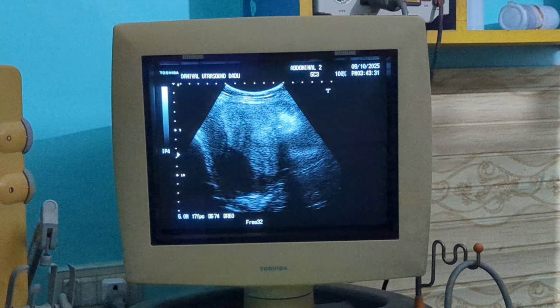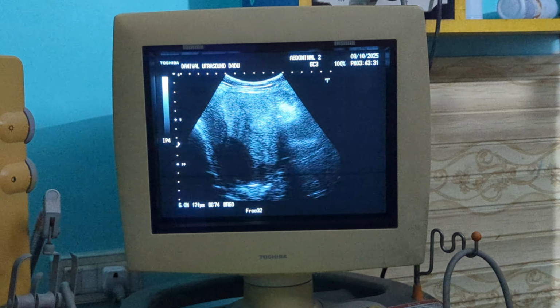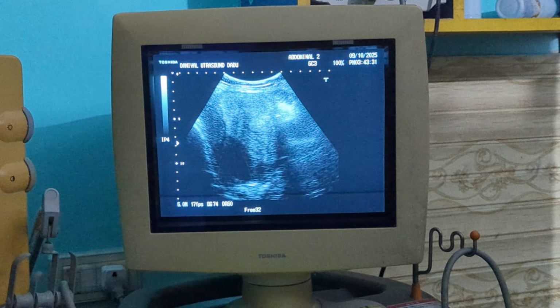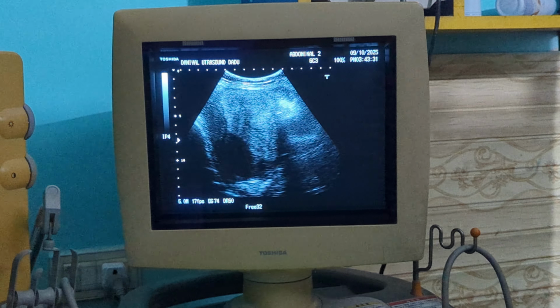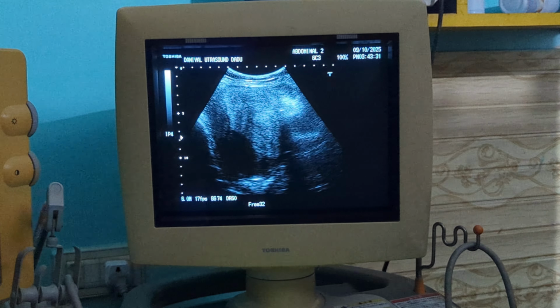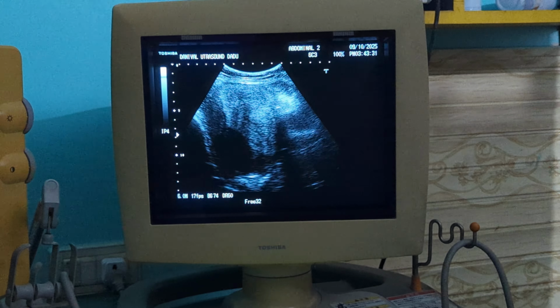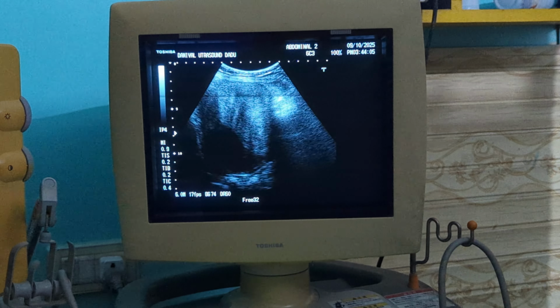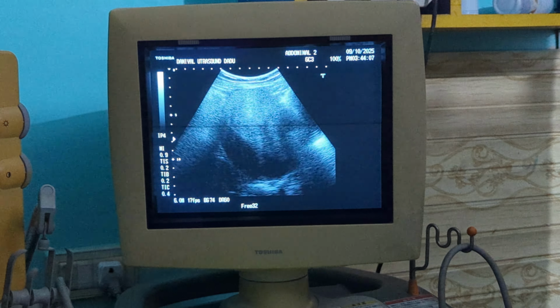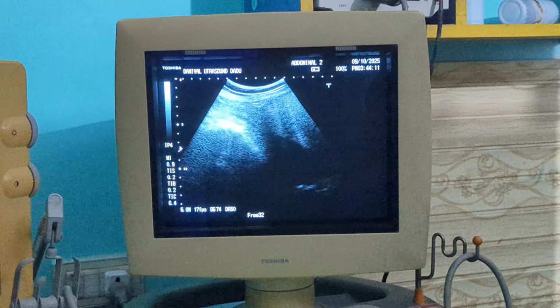So now we have to correlate this clinically with a pelvic MRI to reach the diagnosis, and follow-up ultrasounds are also advised. Transvaginal sonography is important. FNAC could be done here. So all these things are there.